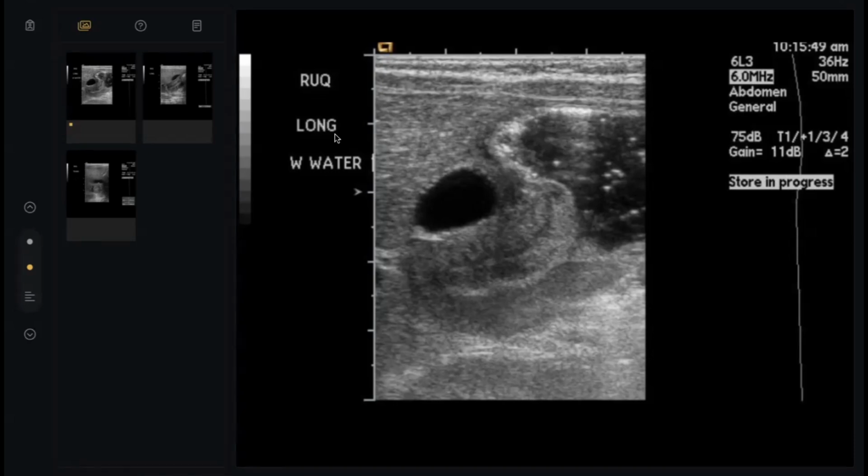Or mushroom sign. Okay. There are a lot of signs associated. Some of them are on the barium studies, some of them are on the ultrasound. It might be a nipple sign or an antral sign or mushroom sign, but this protrusion is abnormal. This is quite characteristic of hypertrophic pyloric stenosis.